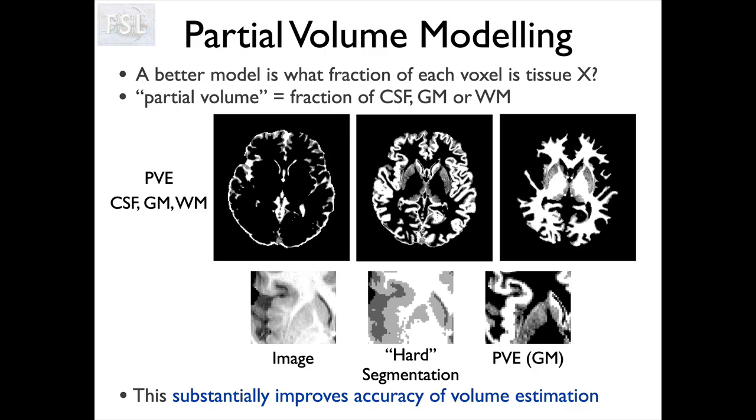There's a partial volume mixture of things where they're on the borders between different tissue types, or even when they're in some of the subcortical structures where actually there is a mixture of axons and cell bodies, which is different from what we would get in the cortex. So it is actually anatomically somewhere in between the grey matter of the cortex and the white matter and the deep white matter.